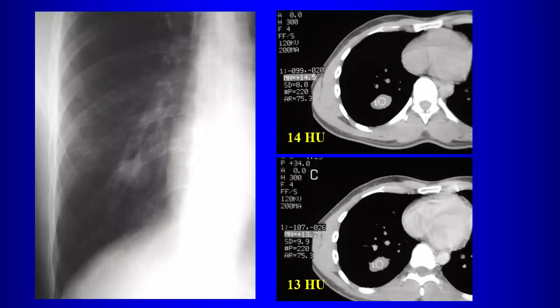If this were in an airway, what would you call it? Mucocele or bronchocele, right? So you could have a dilated airway with a fluid collection in it, which is a mucocele or a bronchocele. Okay. Is there anything else this could be? What might give you a fluid, well circumscribed fluid collection like that in the lung parenchyma?